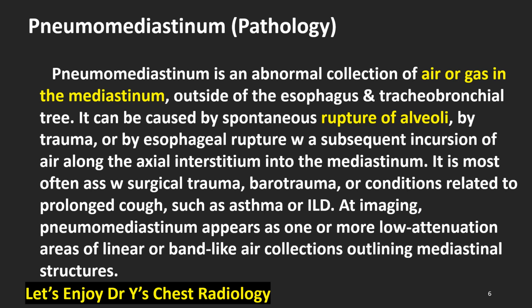It is most often associated with surgical trauma, barotrauma, or conditions related to prolonged cough, such as asthma or interstitial lung disease. At imaging, pneumomediastinum appears as one or more low attenuation areas of linear or band-like air collections outlining mediastinal structures.